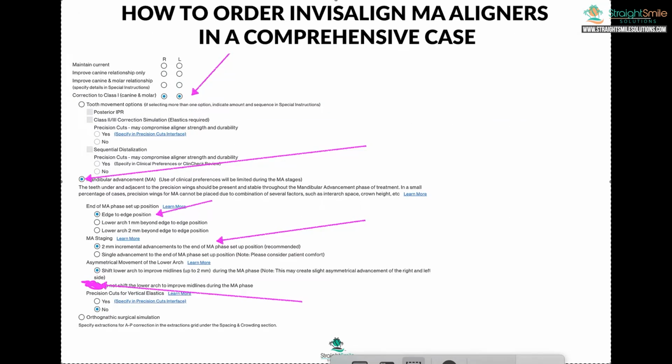Hey, this is Dr. Amanda with StraightSmile Solutions, and today we're going to talk about Invisalign MA, the Mandibular Advancement feature, which is quietly now available with the comprehensive Invisalign. So I'm pretty excited about this because it is an option for small mandibles.